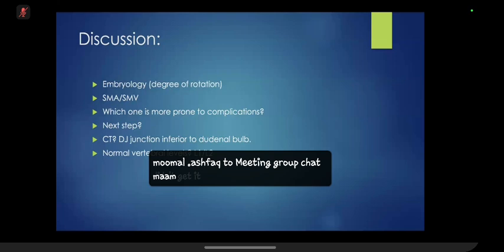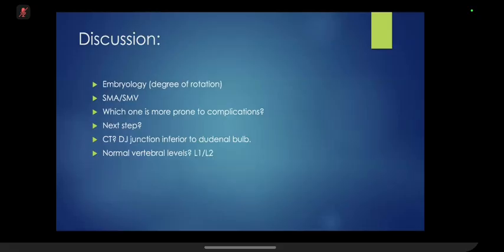On a fluoroscopy film, what is important is that you tell the examiner that the patient has malrotation. The next thing is that, as the baby has this background pathology, if the baby is clinically fine and I do not feel the baby has a volvulus, which could be an acute emergency... In this case, there was no volvulus, but the examiner knows you are going on the right path. You're trying to exclude the acute emergency finding, not to miss it.